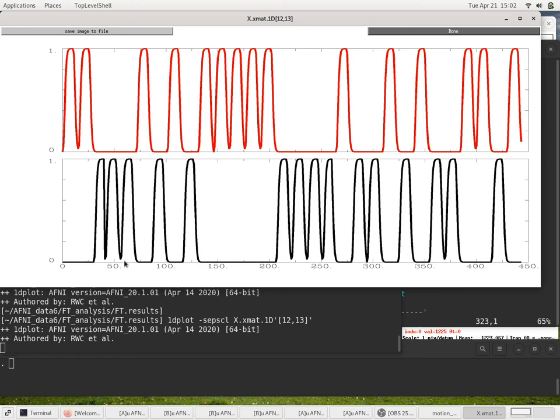That looks good. Where's time point 42 should be. So where you see that, remember we're censoring a little bit here. And if you look at the black curve here, you see it's just shaved off a little bit at the right end here, and that's right around time index 42. That's where we had censoring.